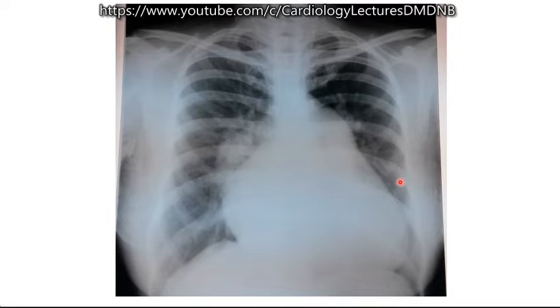Yes. Okay. Then the main pulmonary artery is dilated, sir. Yes, main pulmonary, and the right descending pulmonary artery is also prominent. Yes. And if you see, the end-on vessels are also seen in both the perihilar areas, sir. Yes, in the perihilar area you can see a good number of end-on vessels on the right side. Here you can see one, or here in the hilar region maybe a few more. So obviously this is a shunt lesion.